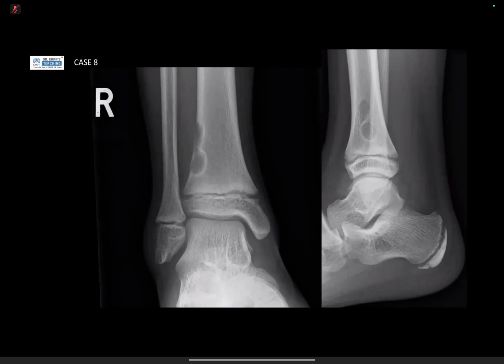Candidate 2? Yeah, so I'm given frontal and lateral radiographs of the right ankle joint of a skeletally immature patient. I can see a well-defined eccentric cortical-based lytic lesion in the lateral distal cortex of the tibia, with well-defined sclerotic medial margins, narrow zone of transition, no periosteal reaction, and some deficient cortex on the superior part.